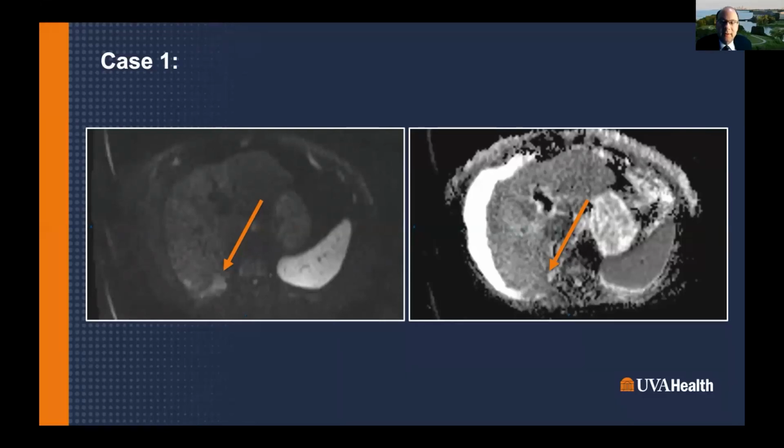I have one other point I want to make. With these higher dose therapies, like the example I showed where it didn't look like there was a response at 1 month and then it took a long time, I think with a lot of these higher therapies you're actually seeing necrosis early on. So I think they're a lot easier to interpret than they used to be. Obviously, I showed you some of the more challenging ones, and AJ had shown some of the more challenging ones as well. I think that's the case, at least with MR, in the examples we showed. And the ultrasound I thought was outstanding and very interesting from my perspective.